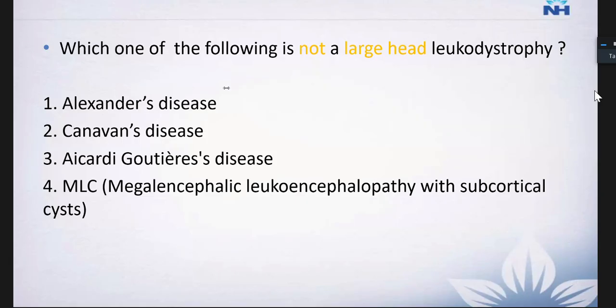The other question that I can see here is how to differentiate myoinositol versus glycine. Usually the myoinositol and the glycine peak are seen at 3.4, 3.5 ppm. So at 1.5 T, that is low T, both will show that peak at 3.5 or 3.6 ppm.